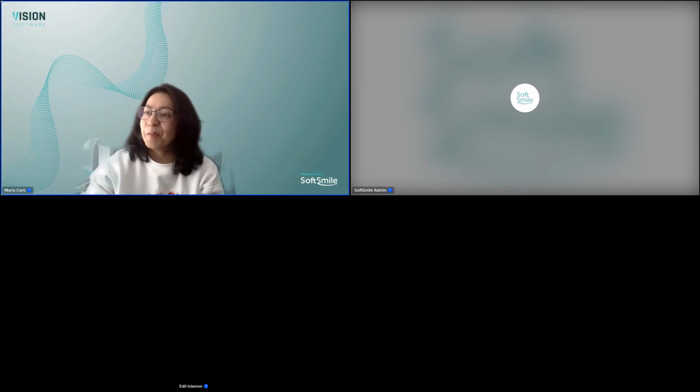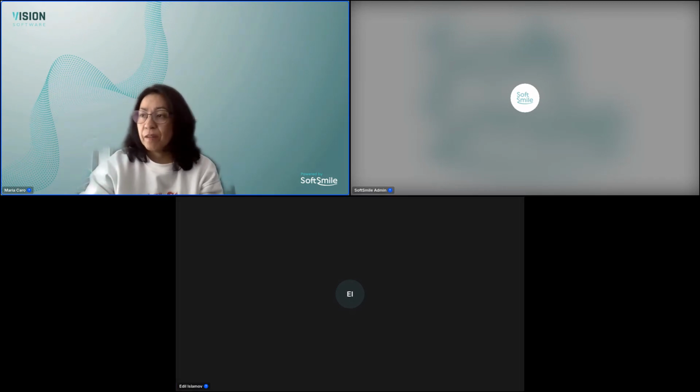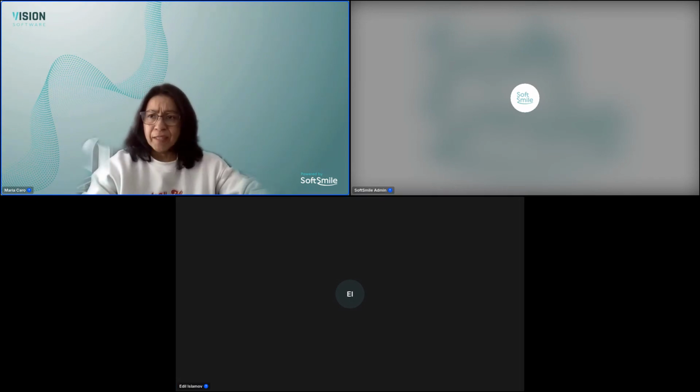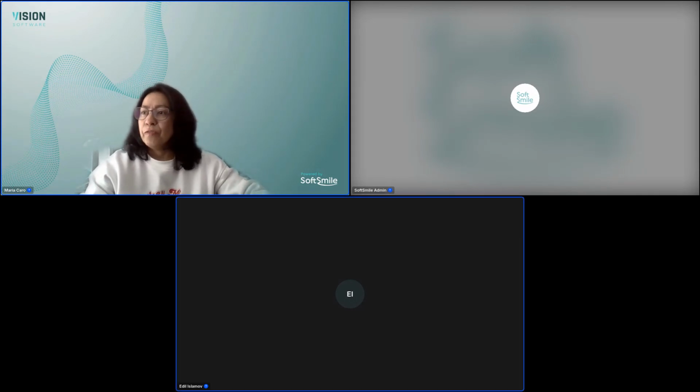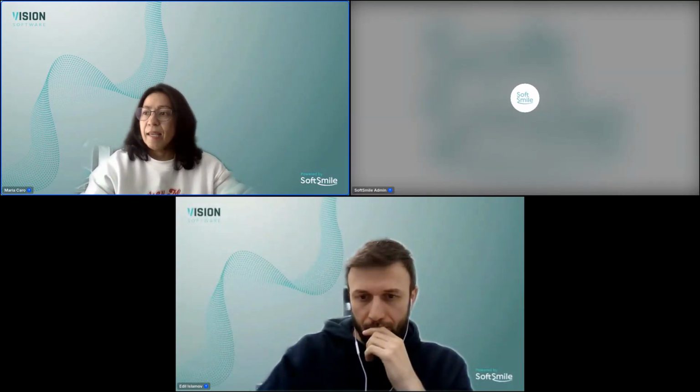No problem. We're going to continue, and we have a lot of stuff to cover today. So our 5 topics that we'll be covering today are going to involve the PLY file format that is now supported in Vision. We will then move forward with our new auxiliary, the translate blocks, and we will follow with the double limits, alternative treatment plans, and we'll end with our cephalometric module.